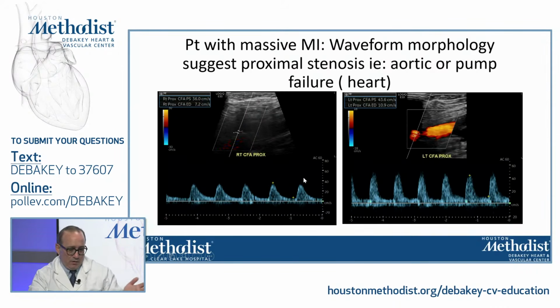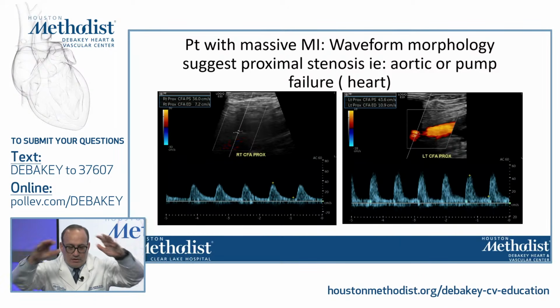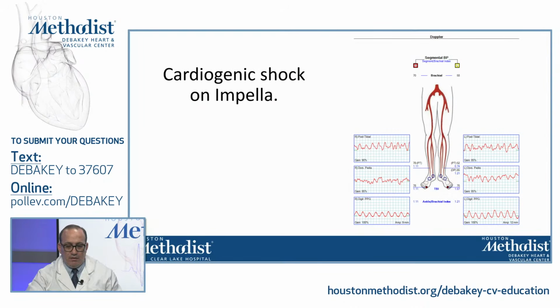There's definitely iliac inflow disease potentially. Could it be on both sides potentially? Or this could potentially be in the face of some disease, not very significant disease, but cardiac or pump failure.